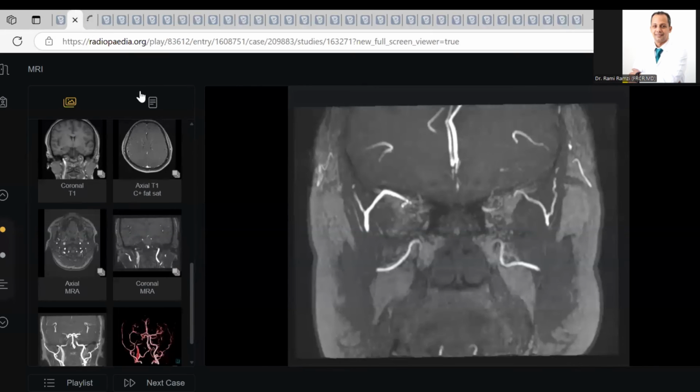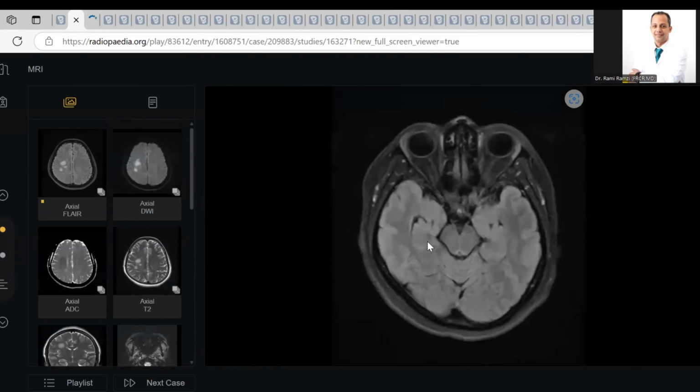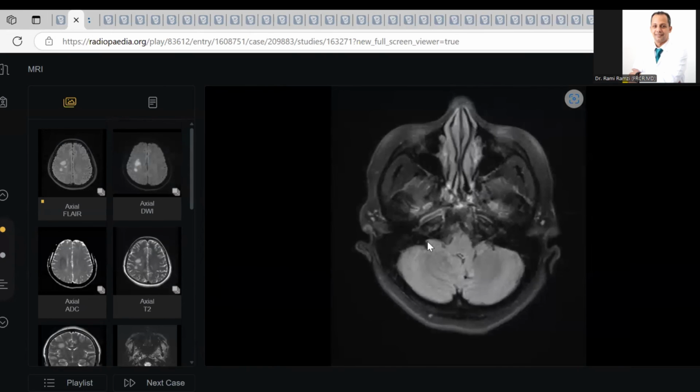Case before, take care, my colleagues, with emergency cases. This is pass or fail. You start very well, our colleague, when you pick up this, and then you stop many times here. My colleagues, the skull base is very important.